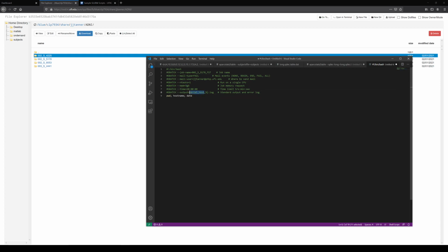And then here I'm going to change this name. This is going to be an output file. So the job name doesn't really matter that much because that's just whatever is going to HiPerGator for the scheduling. But it's good to be descriptive so then if you were looking at what jobs were running, you could tell which one was which. And then this is the output file. So it will output a log file. In this case, it's going to be everything that FreeSurfer is doing. And so I just like to repeat the job name, keep it descriptive. You don't need to change that. The %J should be a timestamp.